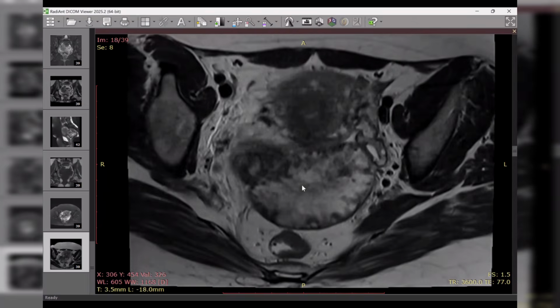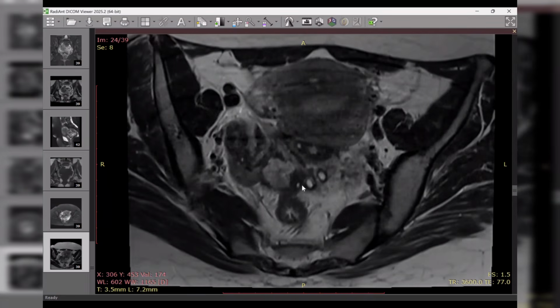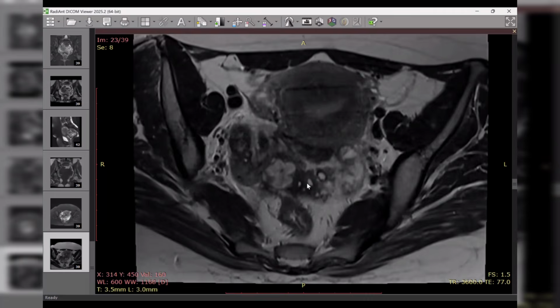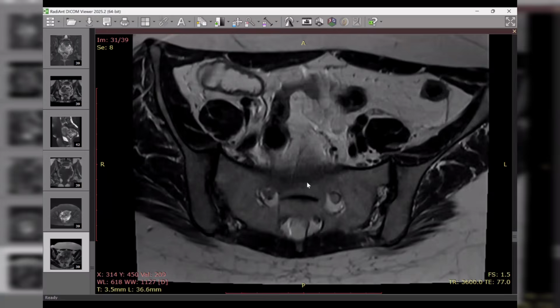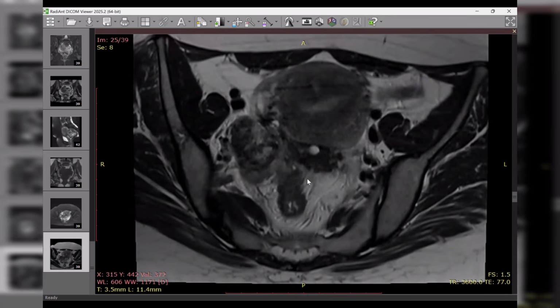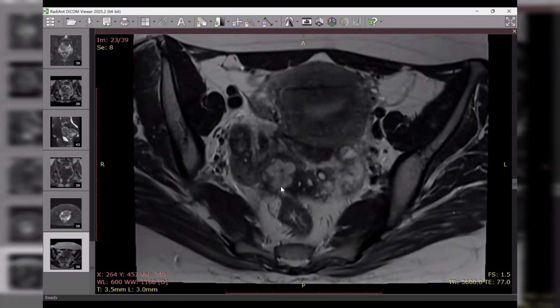Can you see my screen? We can see your screen, Dr. Fathallah, but I don't know about candidate number 12. Are you still here? Dr. Fathallah, can you hear me? Yes, I can hear you clearly. Okay, can you please review the findings and give me the final diagnosis?